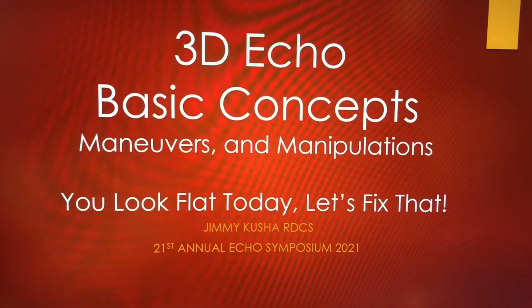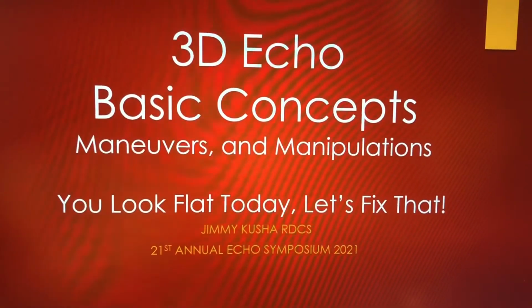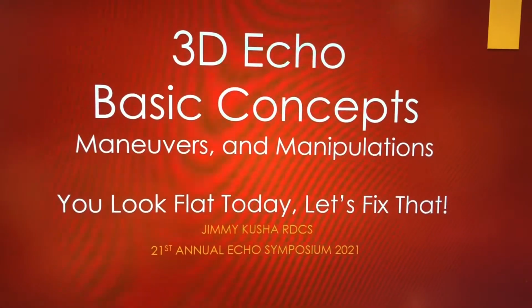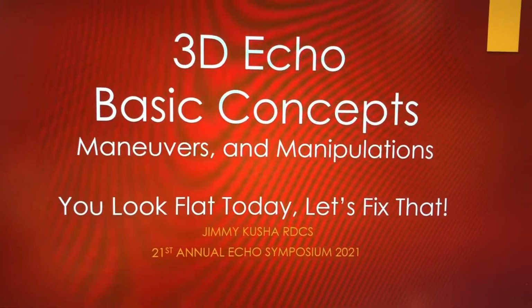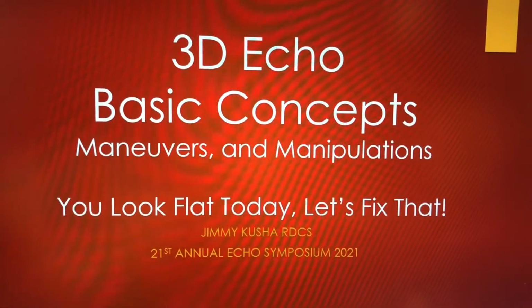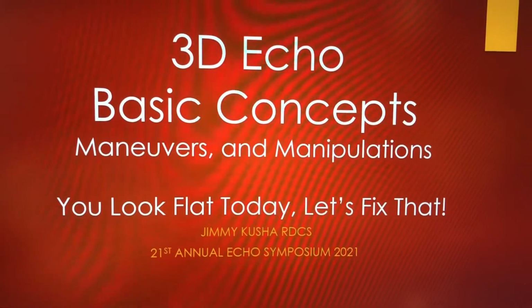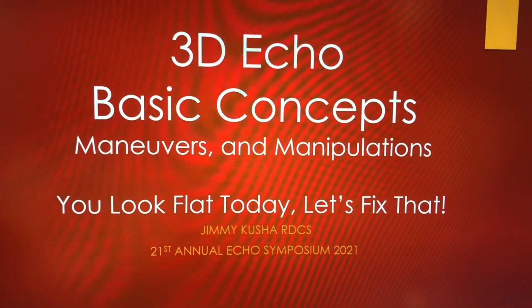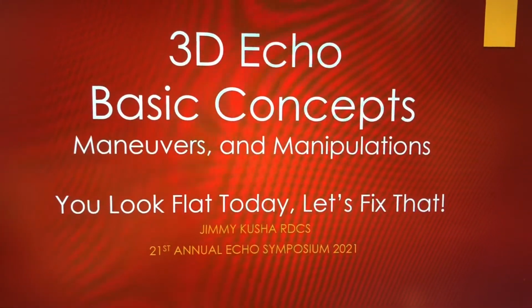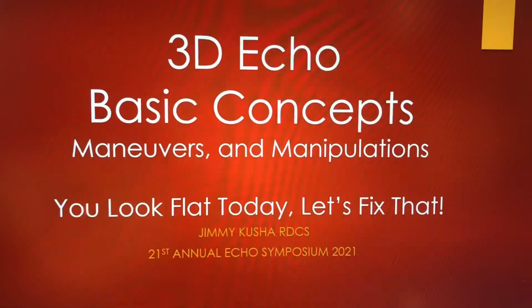I'm here talking at the 21st Annual Echo Symposium in 2021, virtually again, just like last year. We're going to talk about some basic 3D echo concepts, and we're also going to specifically talk about different maneuvers and manipulations you can do on the data sets of the 3D volumes.